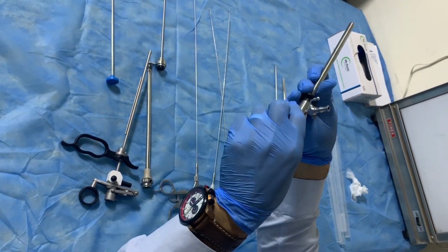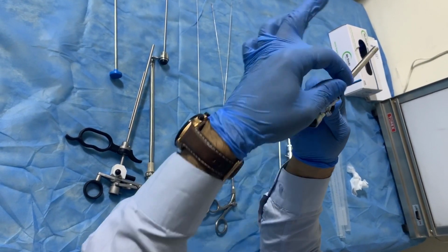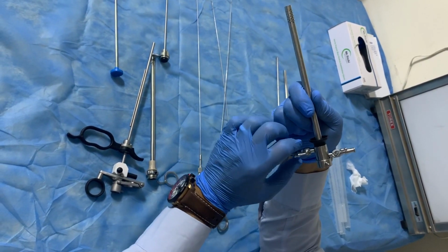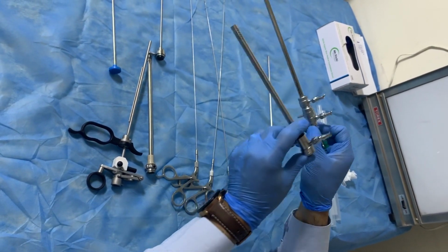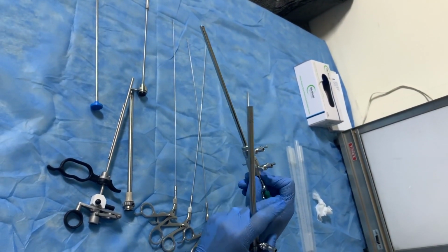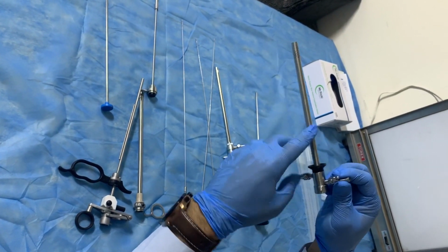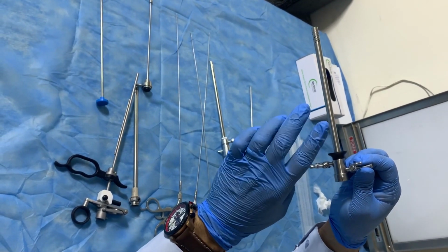For exit of fluid. And don't forget, this source near to me for input and far away from me for output. Sometimes both of them are the same level, like this. But don't forget, beside of me it is for input, far away from me for output. This one, beside of me for input, it is up. Far away from me, it is down for output.